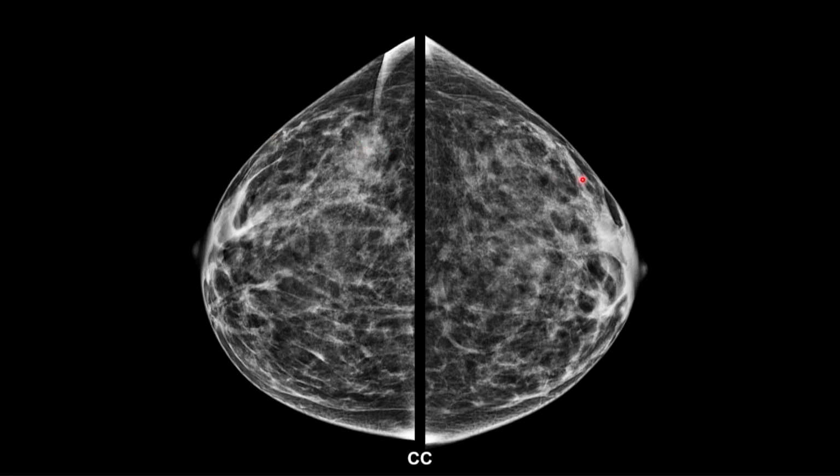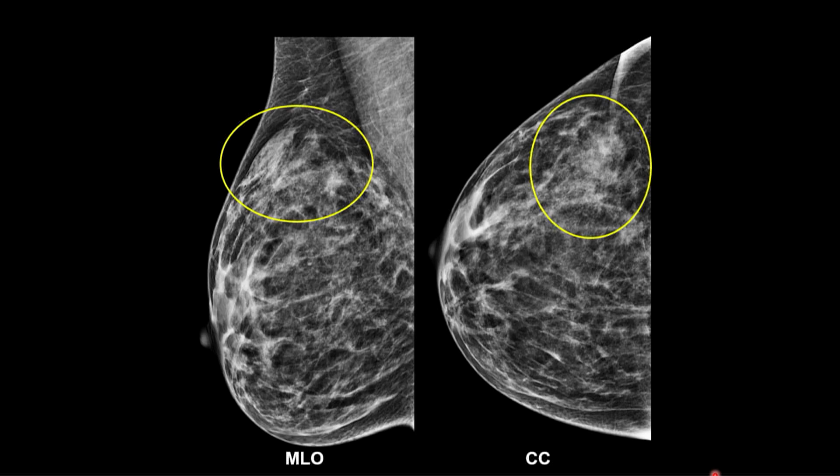This. You're going to see that way before you see tiny little calcifications. So what about that? Well, they decided not to work this up. They could have recalled it and worked it up. It probably would have wound up in the probably benign category because hopefully there's nothing there. Again, I hope we were right because it's a reasonably current case and we haven't seen her yet again.